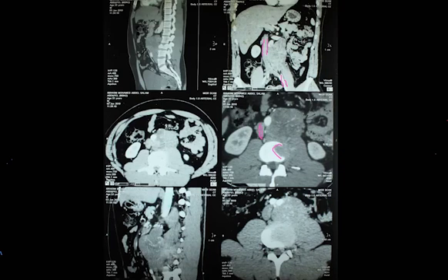So this was indeed a man who had an orchiectomy or orchidectomy, and these were metastatic nodes from his testicular neoplasm. He was receiving chemotherapy. And why did he develop the pins and needles in his feet, in both feet? What are these pins and needles, Mona?